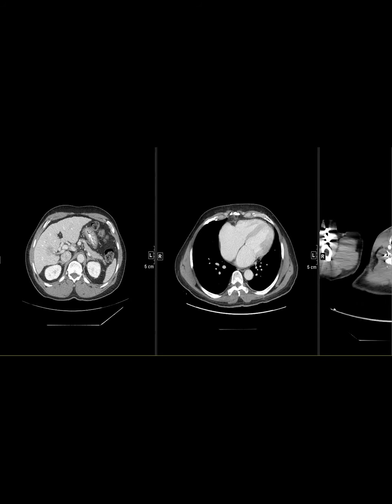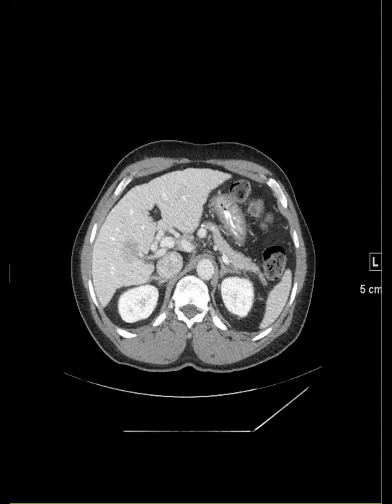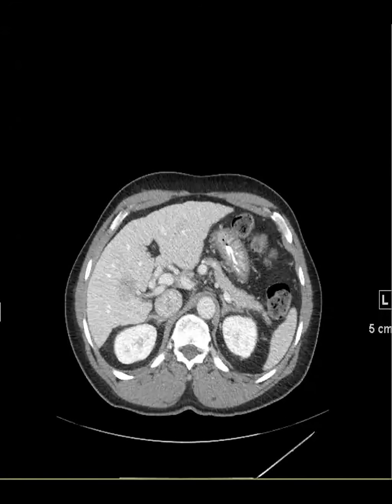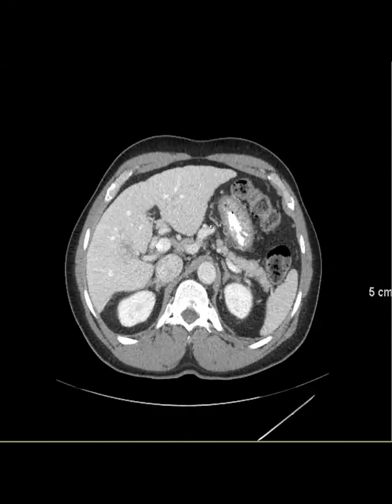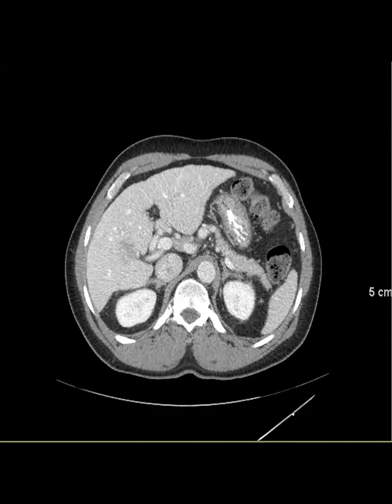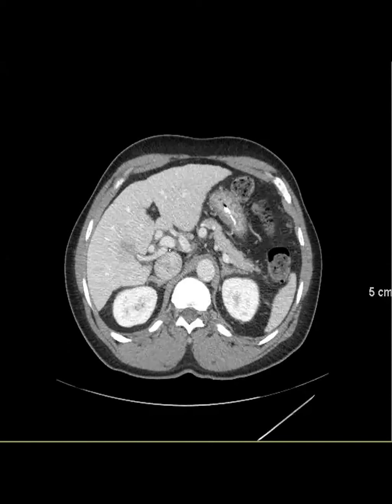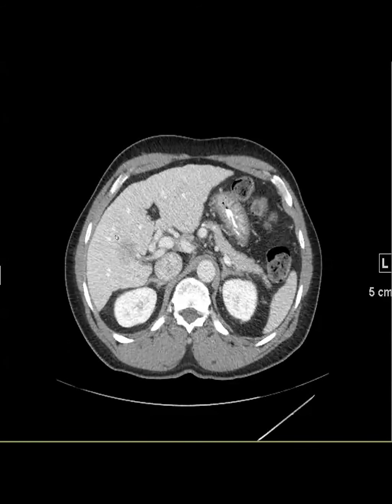So we'll start with a sort of a theme, I guess. When I do this, does it zoom in on the screen or no? Okay, cool. So this is a cirrhotic patient, and this is a study from just about 11 months ago, and the patient came in, I think they were just screened for HCC, and you can see that there's this kind of ill-defined hypodense area on the delayed phase.